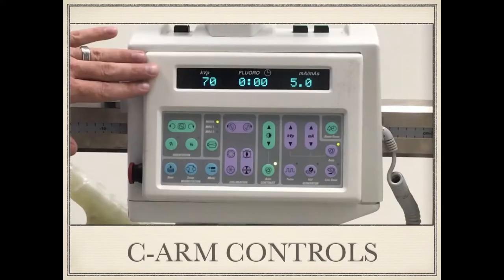When we talk about the workstation, there are three figures which are displayed, which we can change. One of them is the current, which is displayed in milliamperes. The other one is the voltage, which is displayed in kVp. And then in the middle, you have the fluoro time. So this is how the workstation looks like. We'll talk about the different switches in a little bit.